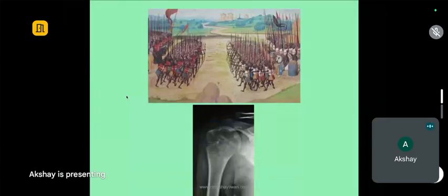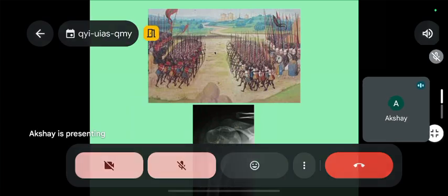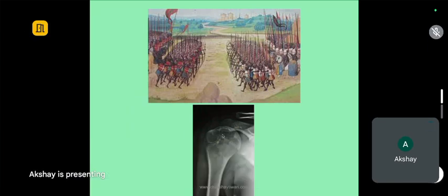Okay, so we were here. So you can see the two armies do not have the wall in the middle, and then you can see there is sclerotic line on one side, but on other sides there is no sclerotic line. The demarcation is still pretty well defined.